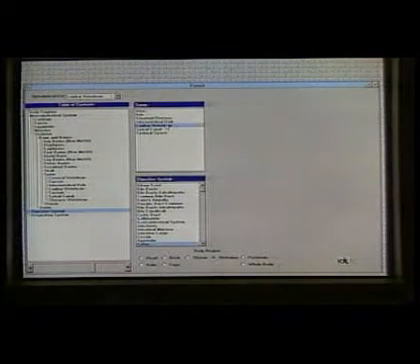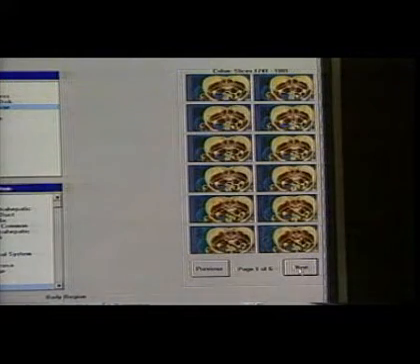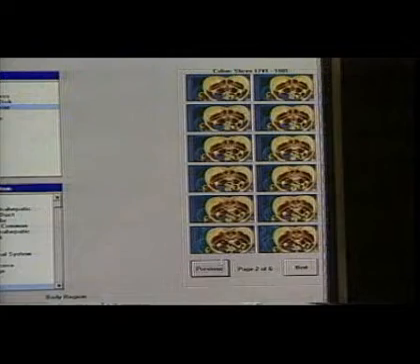Clicking on lumbar vertebrae reveals that the lumbar and the colon appear in some of the same slices. Let's look at the colon. Double-clicking on the colon displays thumbnails of the images of the colon. If there are several pages, I can flip through them. Finally, I click on a thumbnail to retrieve the full-size image.